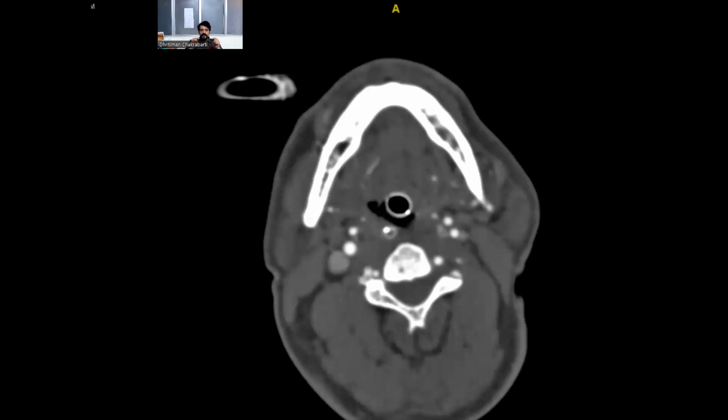After that, it will go anterior and medial, on the sides of the cavernous sinus, and then it will loop back on itself again in the superior part of the cavernous sinus. This portion is known as the clinoidal segment. Before that was the petrous segment till the cavernous sinus.